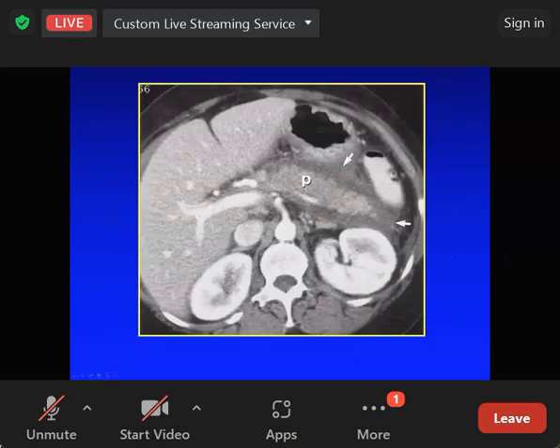So just a few quick examples of acute abdomens on CT. Very easy because we've got letters marking the organ of interest, and here we've got P for pancreas. You'll notice the interdigitations of the surface of the pancreas, and the pancreas is surrounded by fat, but this fat is not like this fat here. This is mesenteric fat, this is subcutaneous fat. It's nice and dark. This is lighter. Why is it lighter? Because it's got water in it. And why has it got water in it? Because the pancreas is inflamed. So this is acute pancreatitis.